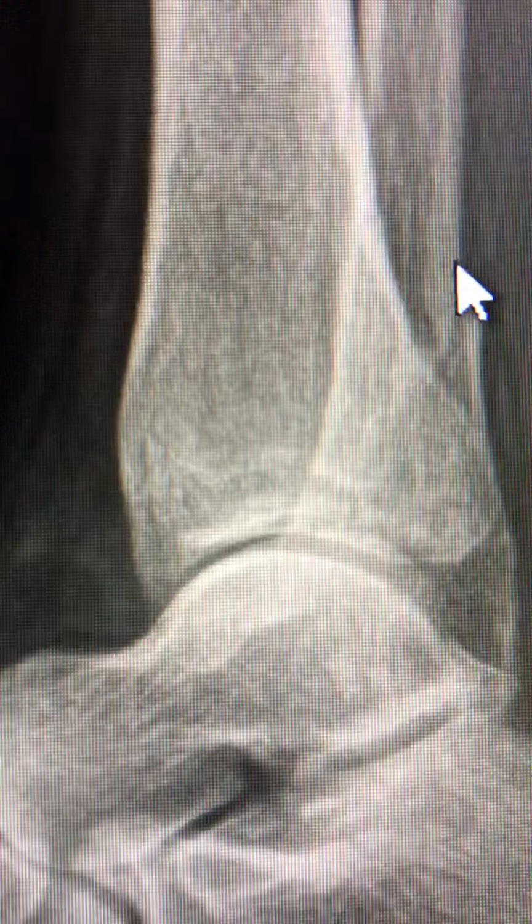That required 9 weeks of non-weight bearing, and let's see what the results are. So the patient refused to have surgery in this situation. I did opt for surgery because of the complexity of the injury. But clearly, like I said in my previous lectures of the fifth metatarsal, the body does miraculous things. It knows what to do if it's allowed to do it. As we can see, the fuzz on the tip of that bone, that's called secondary intention or callus formation, which is bone healing. And we can see the blackness in the fracture line, which is the gap we saw before, is much, much less and more white, which is migration of the calcium phosphates.